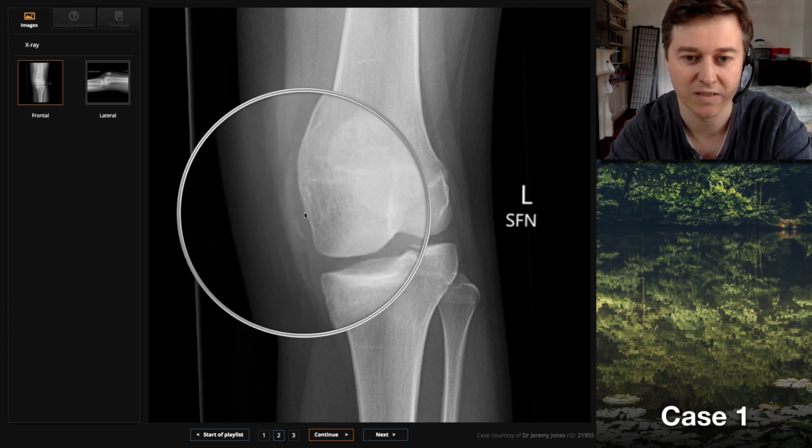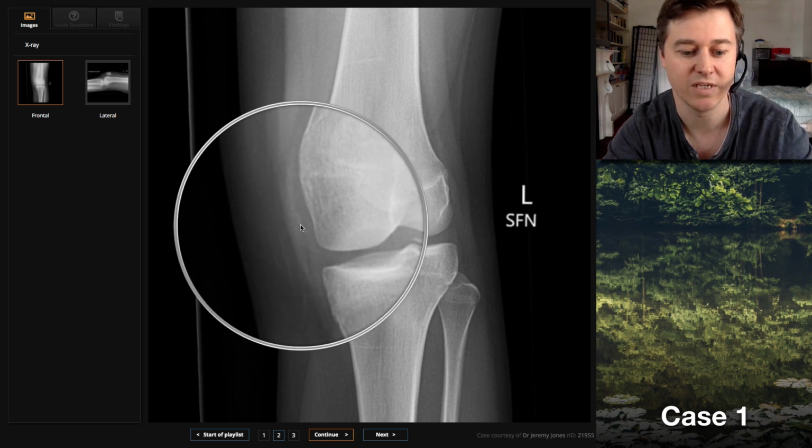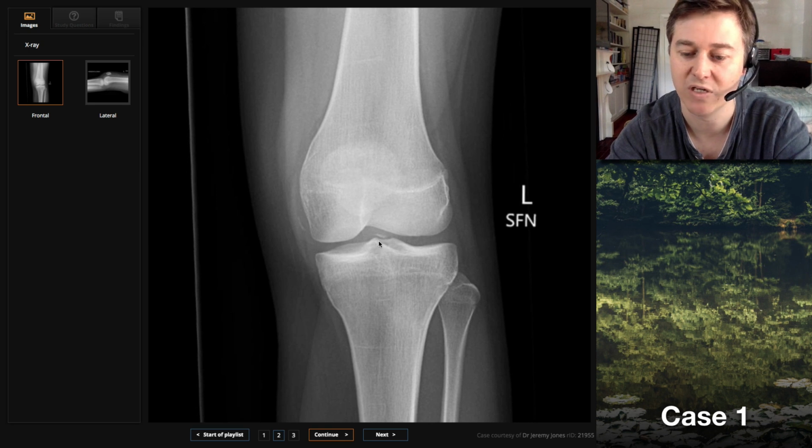the iceberg, and what you're looking at is an osteochondral injury, and that's just the small portion of subchondral bone plate which is attached to it. So we call that the sliver sign. So anytime you see that, the patient really needs an MRI to look for the cartilaginous injury.